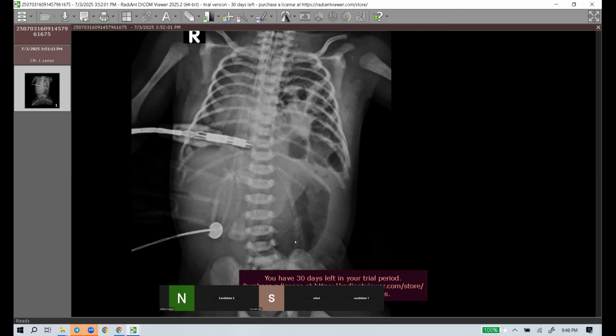And the nasogastric tube, you told it is in situ and the stomach bubble. Then you could also add that it's a left-sided hernia, that this is a Bochdalek hernia. You could have used that word. And other things you rightly, very nicely mentioned, that will correlate with the antenatal ultrasound. Another thing to showcase your knowledge and gain extra marks is to mention the associations, like I am also looking at the vertebral bodies for any spina bifida or any vertebral anomalies, any association when you get genetic or congenital defects.